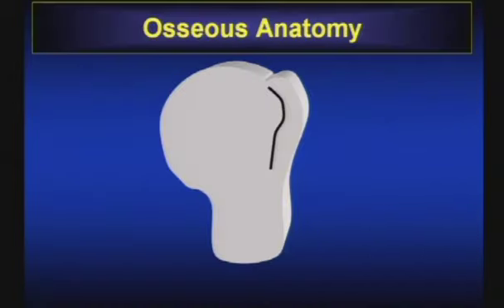So having said that, let's go ahead and get started with our first topic, and that's looking at gluteal tendon attachments about the greater trochanter and pathology associated with them. If we're talking about gluteal tendons about the greater trochanter, you might wonder why we're looking at a cartoon of the humerus. Well, we're doing that so that we can emphasize an anatomic theme.